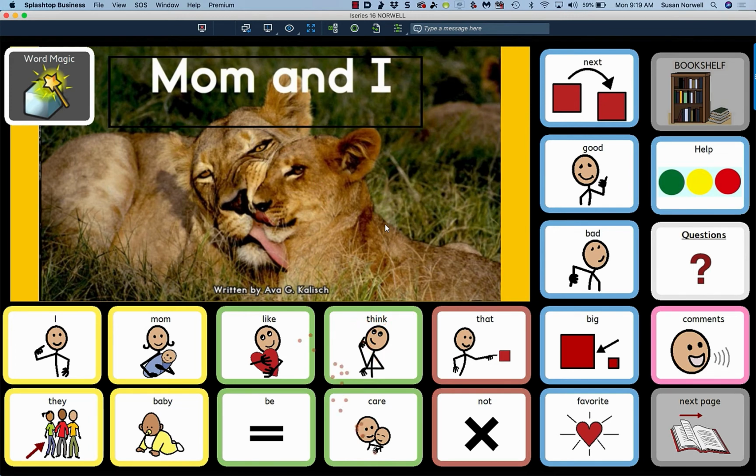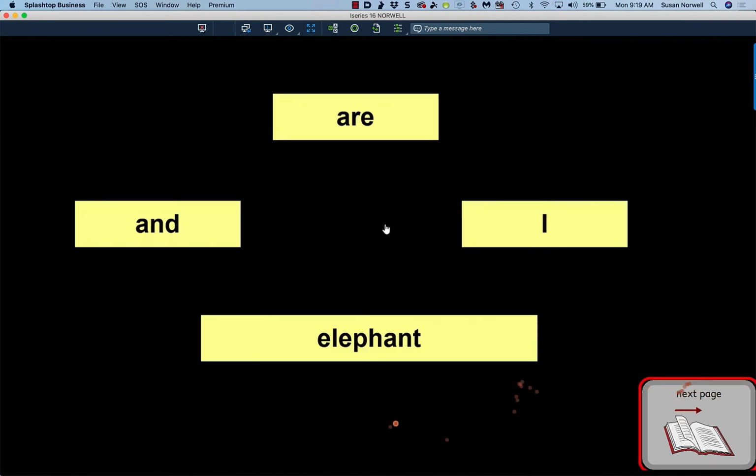In other words, this doesn't have like a click. It's not letting us activate the device. Which is okay. It's just because that's what I'm having to do right now to actually do this process. There we go. So we can see where the kid is looking in terms of the eyes and tracking down to another word. Even if they go there briefly and not long enough to activate it, they're there. And are they looking at the beginning of the word and then reading toward the end of the word? That would be really cool, wouldn't it?